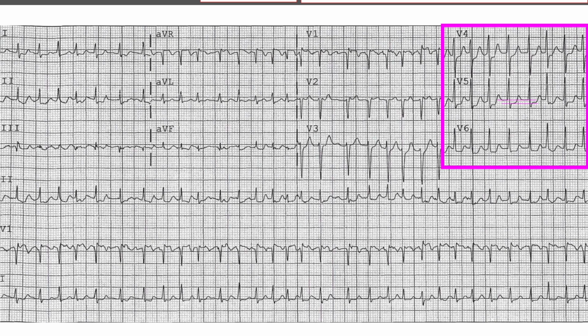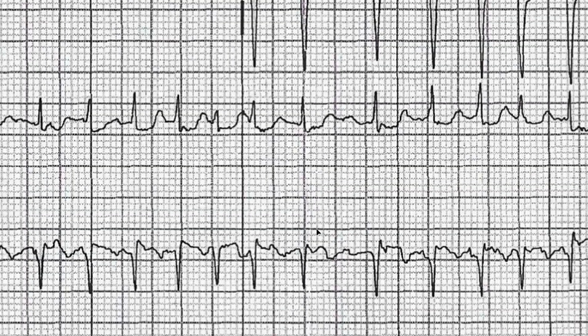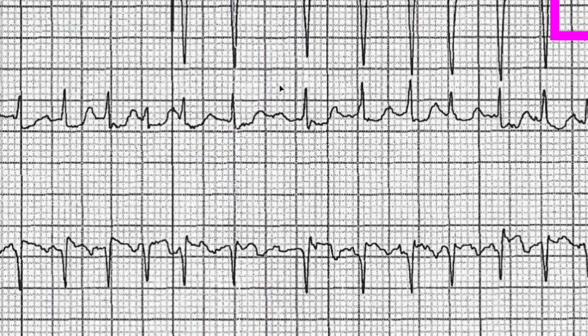Okay, where was I? So to try and figure out what this is, to be 100% sure, it may be difficult just looking at the ECG. But if you are the one capturing the ECG and looking at the screen, see this little break here where we caught this P wave? You might get more of these breaks and they might be longer. So you just let the machine run while the patient is hooked up and you're hoping for a bigger break.